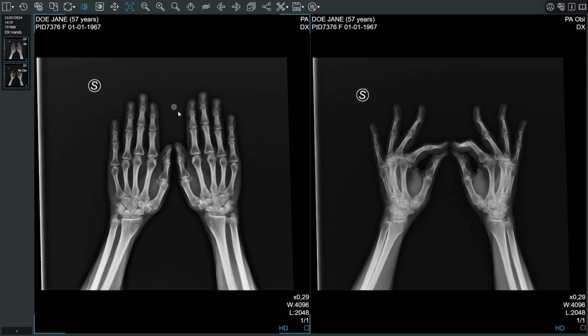To print a set of selected images, first select the desired images by clicking the checkbox in the bottom right corner of each panel. The total number of selected images will be displayed next to the Select/Deselect All Images button in the toolbar, which can be used to easily deselect or select all images in the study. Then, click the Print button in the Export section of the toolbar.